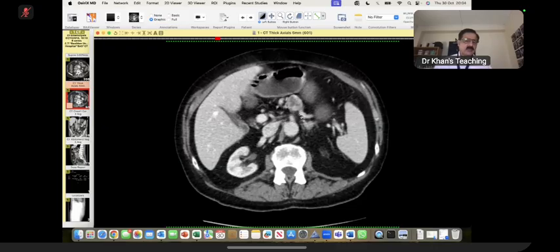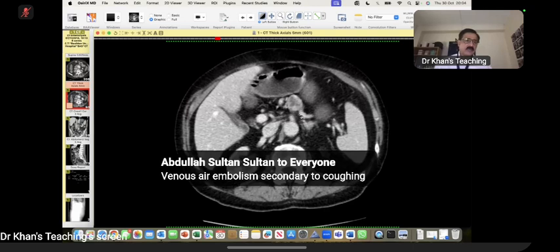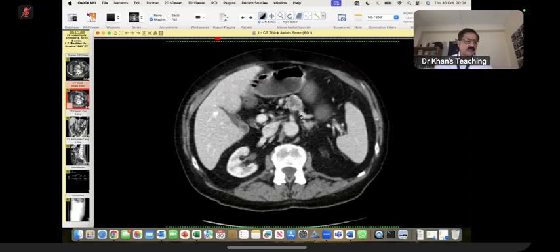It is a neuroendocrine tumor, an extrapancreatic neuroendocrine tumor, and my differential is this, this, this. In the real world, what we do is that if they are functioning, some of the surgeons just want to get rid of it. They tell the patient, and if the patient is willing, they just remove it. Of course, you can do an EUS-guided FNA and things like that. Advanced imaging like nuclear scanning, venous sampling, etc., in most cases are not needed.